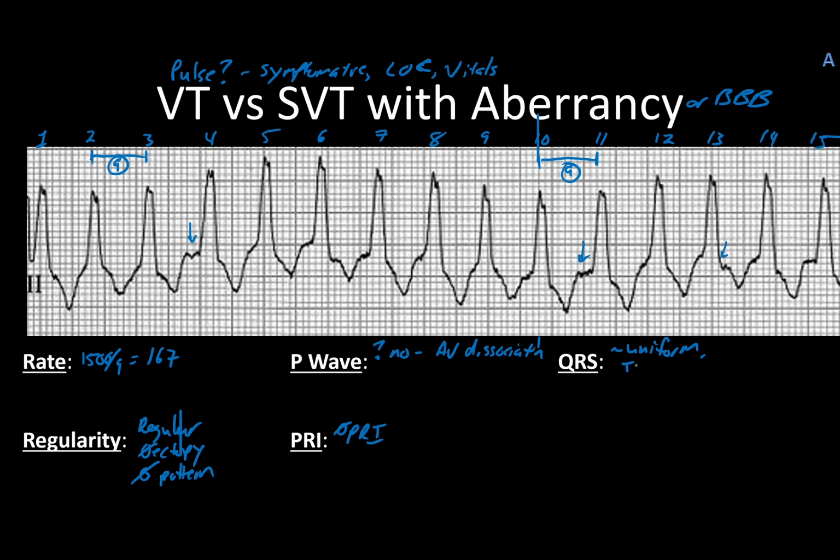They are tall. They appear to be wide, although that's not very specific. They have an R prime shape to them. And it looks like my T wave is inverse.